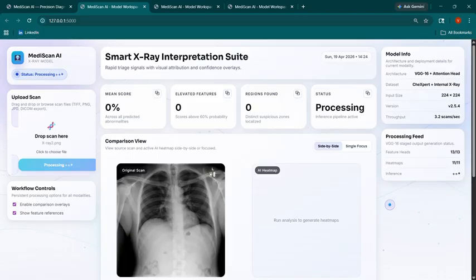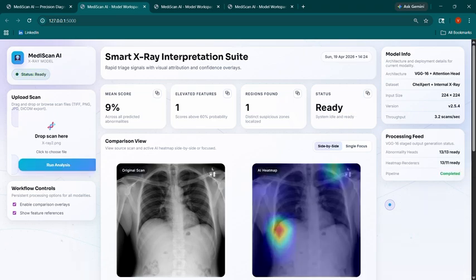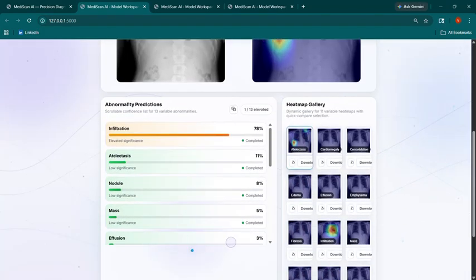This is the overall working prototype of our project MediScan AI. This is not just a black box AI where you give an input and it gives you an output, but you don't know what's really happening inside to get that output. We chose transparency, and we show you how the output is exactly generated through the Grad-CAMs and how it's highlighting the suspicious areas. It's not just going to give you a binary answer like cancer is present, yes or no. It gives you the parameters on which the presence of a tumor or a cancer might be there.